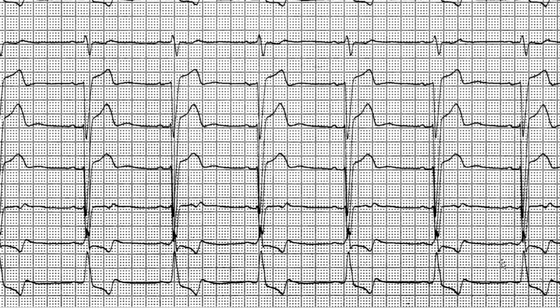Okay, there we go. Yeah, so here we say that this is the terminus, i.e. the end of the T wave. The second half is positive, the first half is negative. We describe the T wave's name based on the first half. So we say biphasic, pre-terminal, i.e. before the terminus, negative.